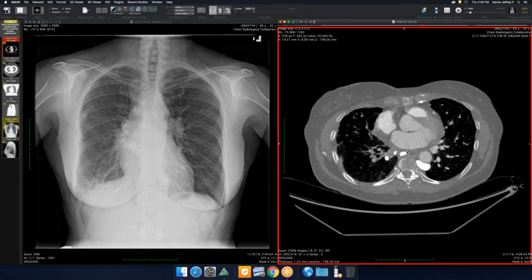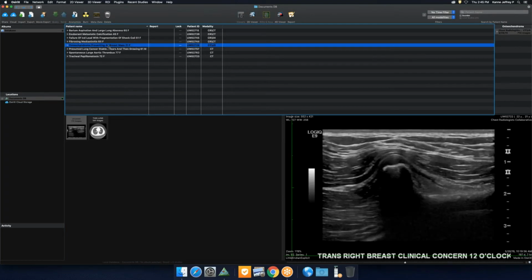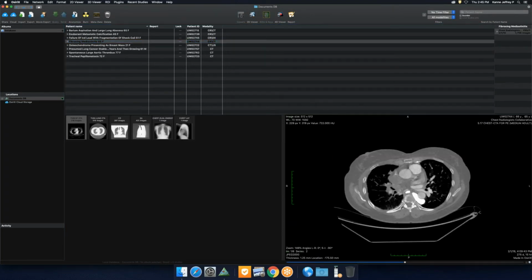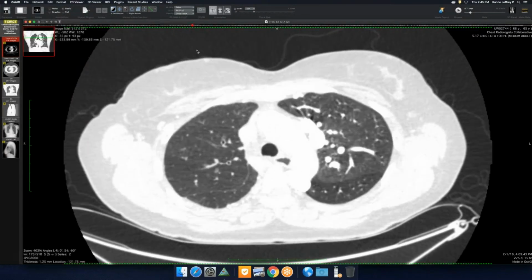So everything's going through this collateral pathway. So a case of fibrosing mediastinitis, presumably from histoplasmosis. And Jeff, that lung parenchyma almost looked like lungs do when you have proximal interruption of the pulmonary artery. And I think there's transpleural collateral.